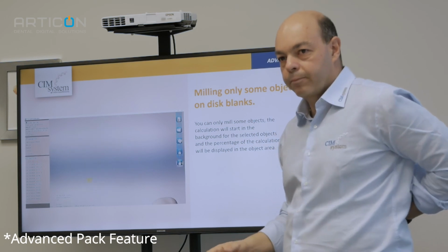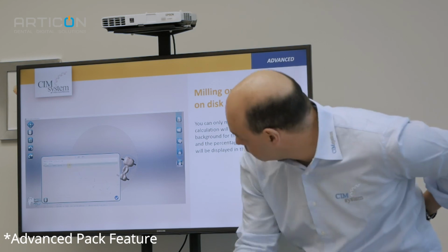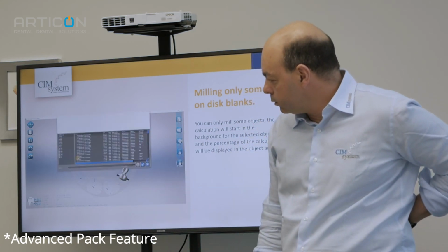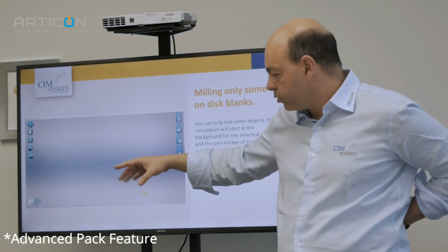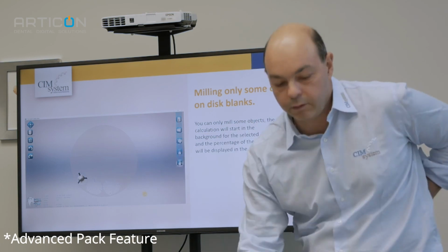Okay, yes. This I like. Look here. I open one copy. Now it changes, automatically opens without showing me the preview. Okay, and I have this.